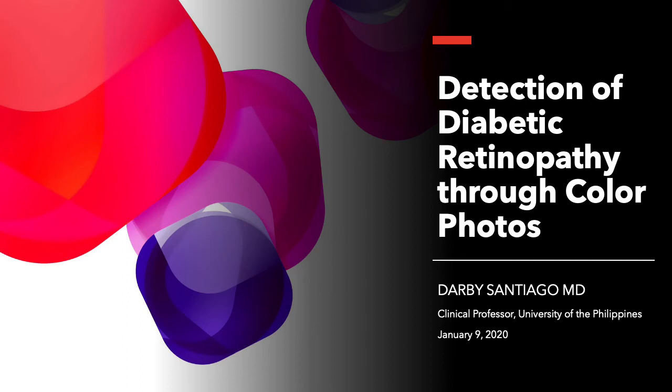Hi, I'm Darby Santiago, a clinical professor of retina surgery at the University of the Philippines and De La Salle University. Today, we shall learn how to recognize and classify diabetic retinopathy based on the features seen in color photos of the retina. At the end of this lecture, you should be able to distinguish whether a person with diabetes has diabetic retinopathy or not.